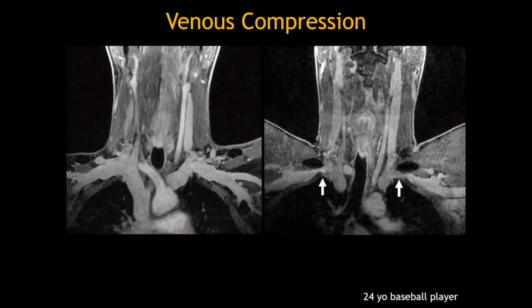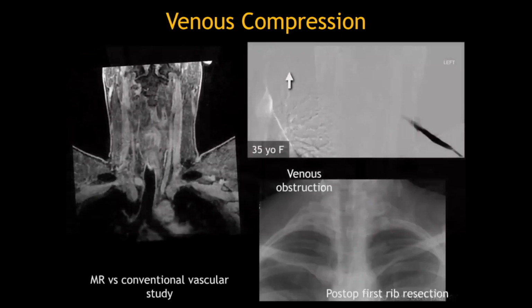I've certainly seen a lot of studies, and even if you just look at your CT chest exams, patients done with contrast, their arms are up so that they don't obscure evaluation of the lungs and mediastinal structures. And you'll often observe that patients narrow their subclavian veins bilaterally as a physiologic response to the position. So there's no good normative data as to how much narrowing is too much. Some suggest that more than 50% narrowing could be associated with thoracic outlet syndrome.